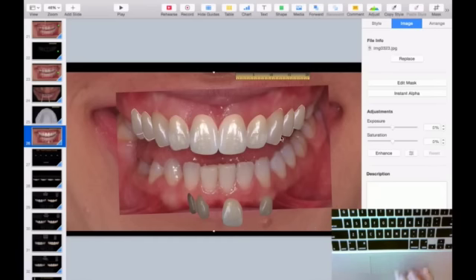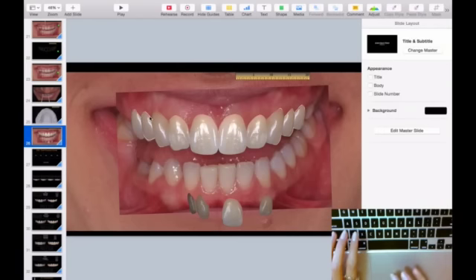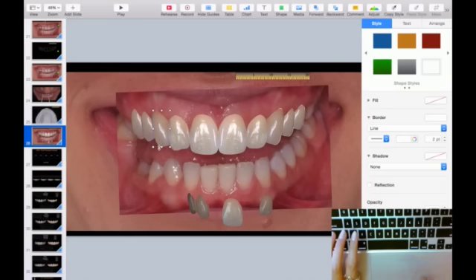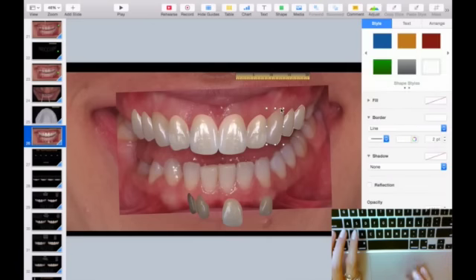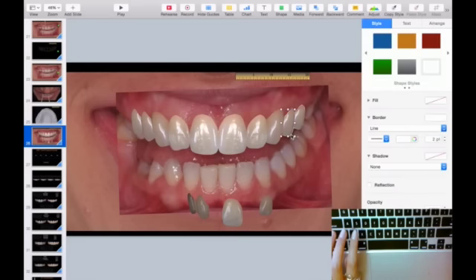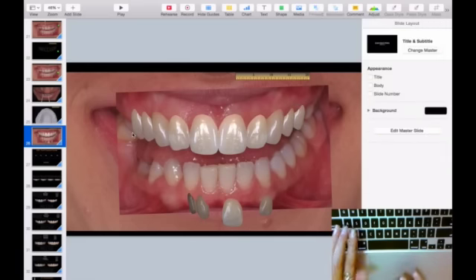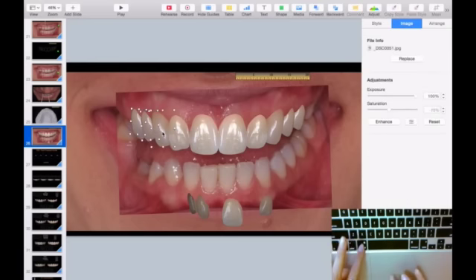positioned. What I like to do now is take out those little white lines that may throw you off. All the ones that you see now, later on, you eliminate the rest. And to give it a more natural look, you hold the Command key and you click on all of them.